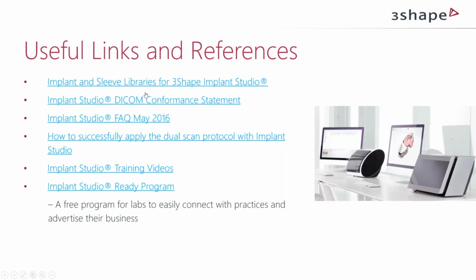And here are some links to different documents we have, which will help you in your daily work with Implant Studio. The list of implant and sleeve libraries for Implant Studio, then the DICOM conformance statement. These are requirements for DICOM files you load into Implant Studio. Then frequently asked questions regarding this version of Implant Studio 2016.